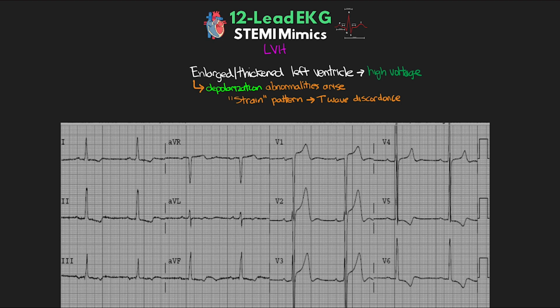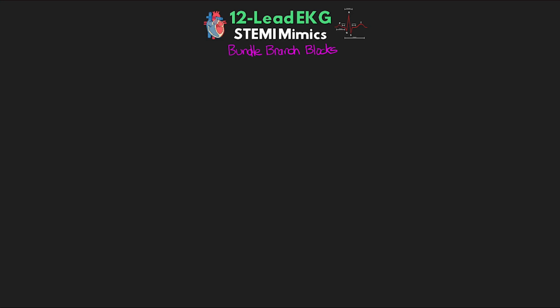This strain pattern results in T-wave discordance, and thus we can see associated ST depression and ST elevation. So in this example here, you can definitely see the high voltage in many of these precordial leads based on the massive size of the QRS complexes. We can also see T-wave discordance, especially with V1, V2, and V3 here, where we have the predominantly negative S wave, and thus the positive T wave and associated ST elevation, as well as in V5 and V6, where we have the predominantly positive R wave with the negative T wave and thus ST depression. Now with this ST elevation that we see, again, if we draw our line, we see that we have the concave shape.